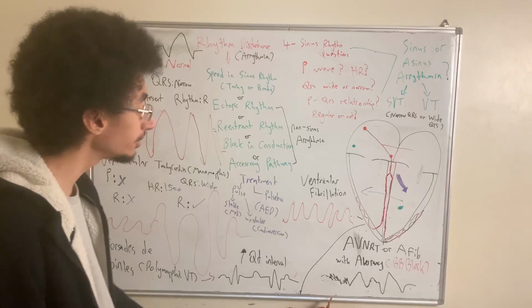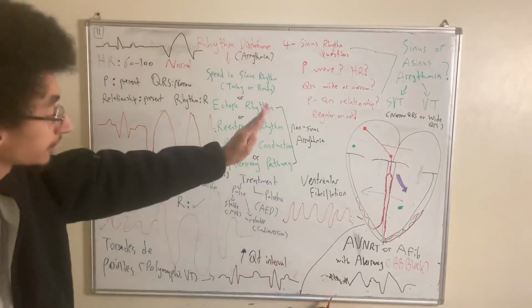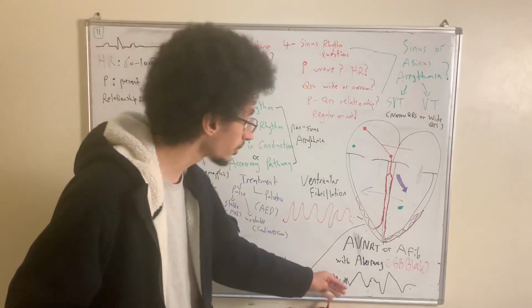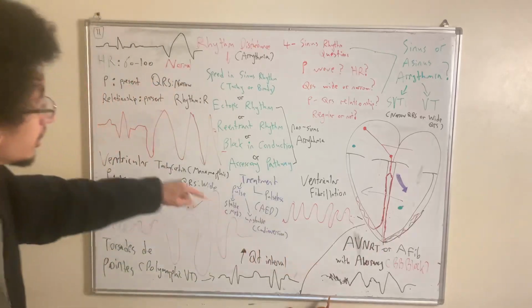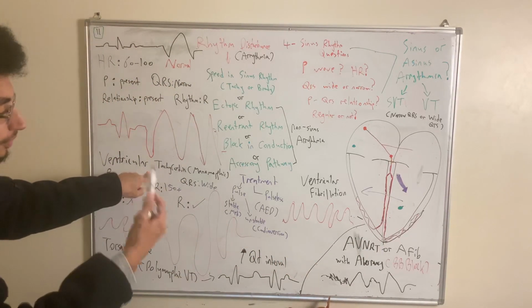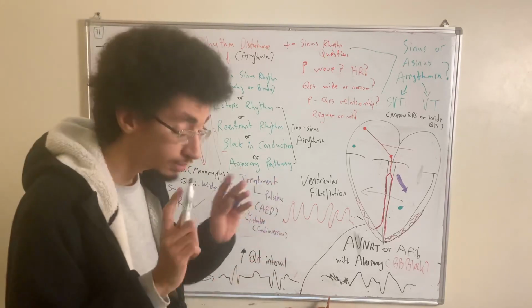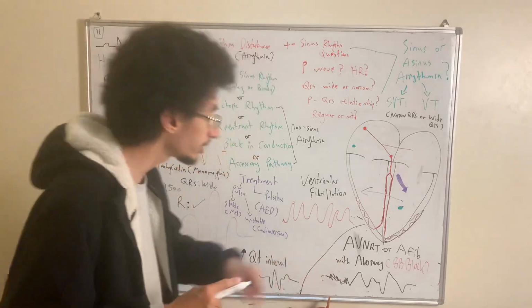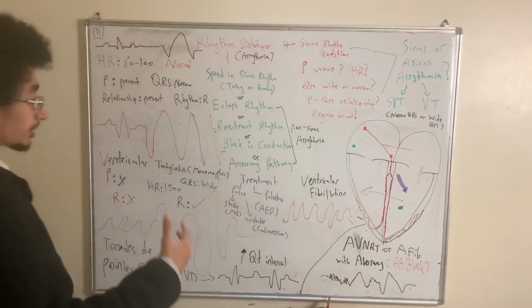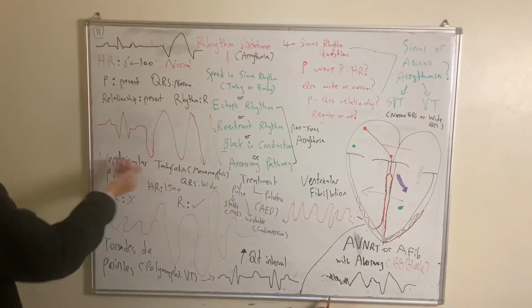On EKG, you might see the initial QRS, the first one, positively deflected, this one could be negatively deflected. This one may show no AV dissociation, but the majority of ventricular tachycardia are associated with AV nodal dissociation. So I just want you to keep in mind, be aware of this condition. This should be part of your differential diagnosis. But obviously, the first one you should think of when you see a wide complex tachycardia is ventricular tachycardia.